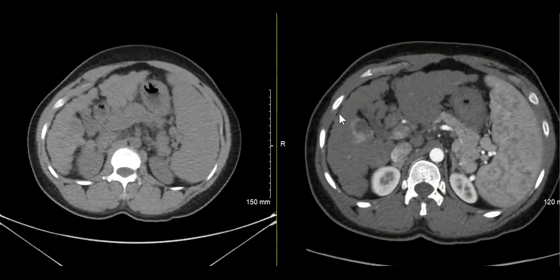This is one of the reasons why, because CK19 positive HCCs more often will have targetoid features indicating much more aggressive behavior. So this was resected. I'm pretty sure she's doing okay so far.